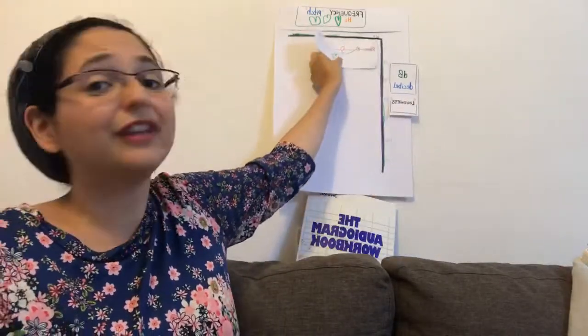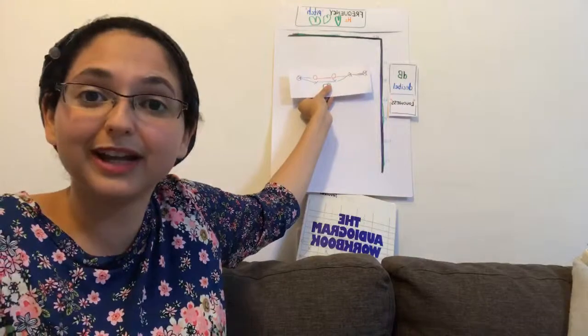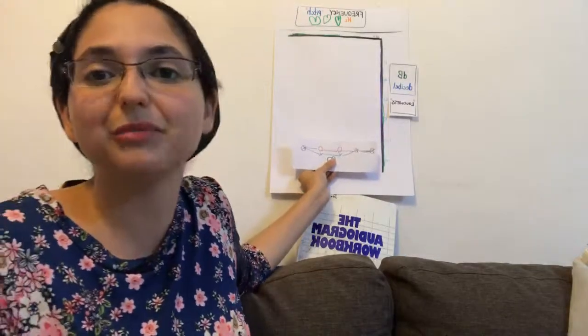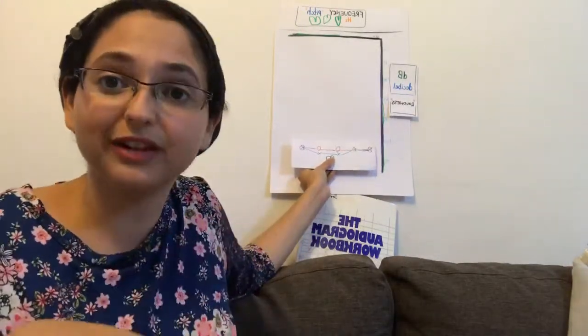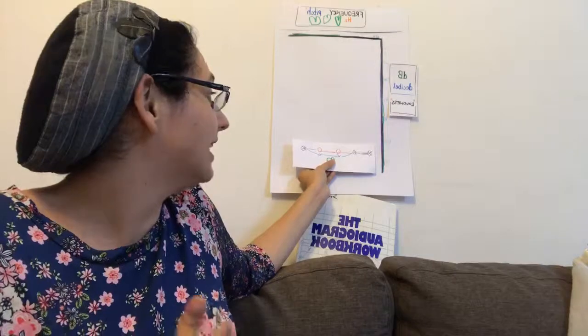But then if there's a hearing loss, then this audiogram might look like this, with a mild hearing loss at around 40 or moderately severe at around 60 to 70. And the lower down you go, the more hearing loss there is. So if you see an audiogram with the lines, the circles and X's all the way at the bottom, then that's essentially a hearing loss that is profound.